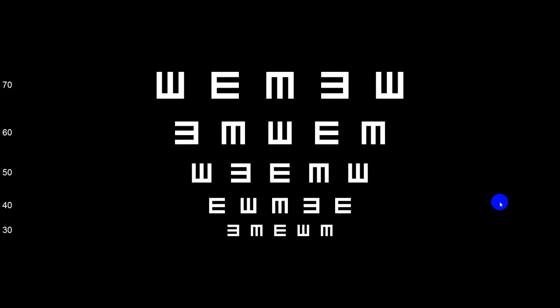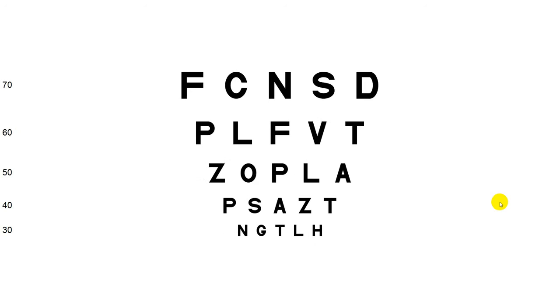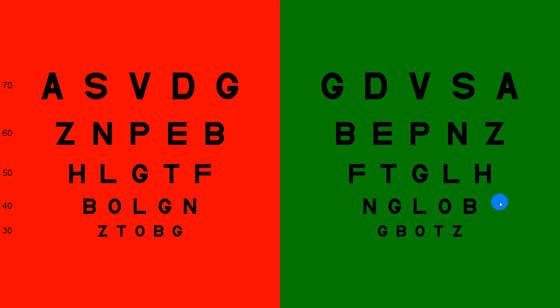And you can invert the screen. So if you want to change the white to black and the black to white, you can do that. And I said the contrast, if you want to put a red-green over anyone, let's go to letters and just hit the red-green. It'll toggle red-green. If you want to do a single line, toggle red-green on, red-green off, red-green on. You want to change the letters, just hit select. It'll change the letters in the red-green.